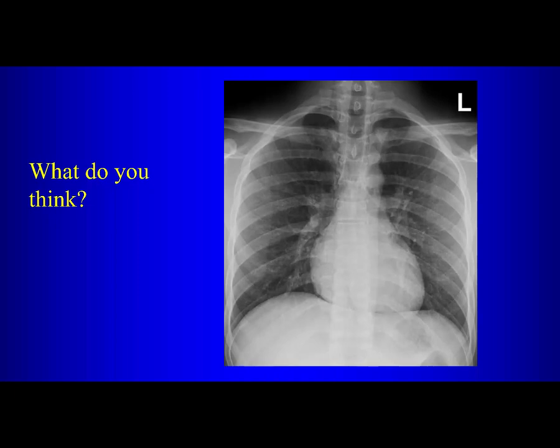Pneumomediastinum. Why? There's also a lucency around the neck as well. Yeah, so there's lucency up here in the right paratracheal region. So here you would consider pneumomediastinum. What are causes of pneumomediastinum? Esophageal perforation. Sure, so esophageal perforation, if that's spontaneous, we call it Boerhaave syndrome, from vomiting. What are other causes of pneumomediastinum?